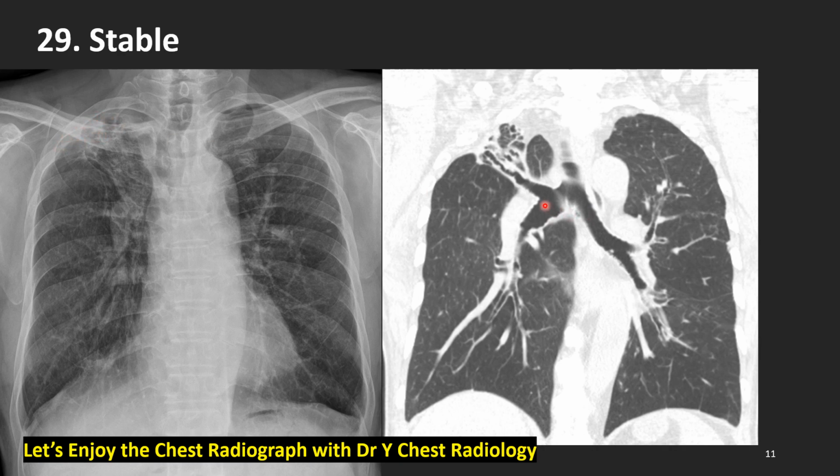This coronal lung window setting shows everything. Right side main airway was deformed and elevated to the right upper side. Minor fissure is elevated, bronchus is thickened and dilated. These are traction bronchiectasis, pleural thickening, cystic change, fibrotic change, peribronchial fibrosis. This is stable findings.